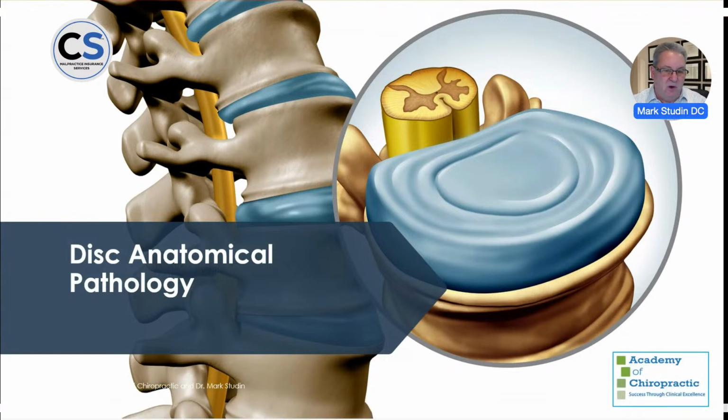This is the spinal cord because it's solid. We know all those things. So now what we're going to do, I've actually got it. Here we go. Here's your spinal cord. It's solid. Sorry, I was moving my mouse in the wrong image.